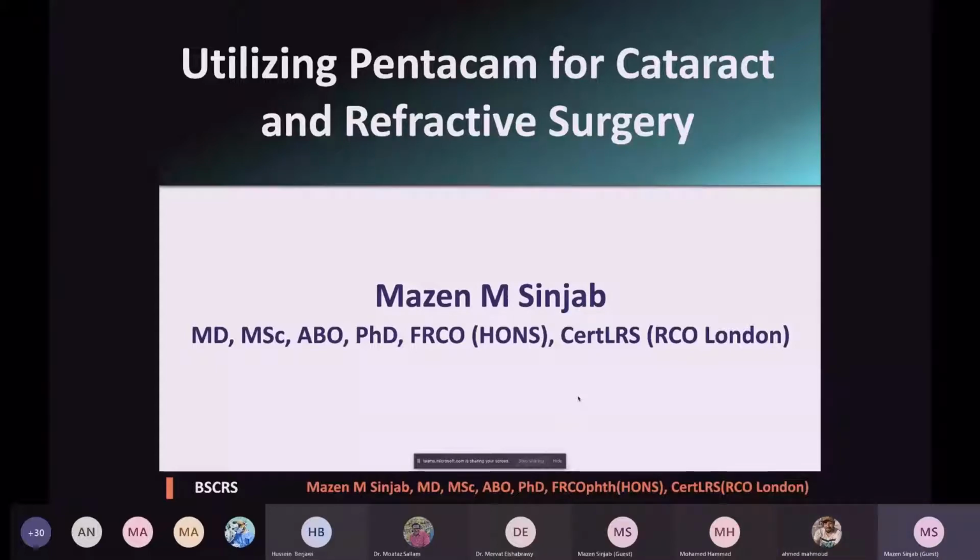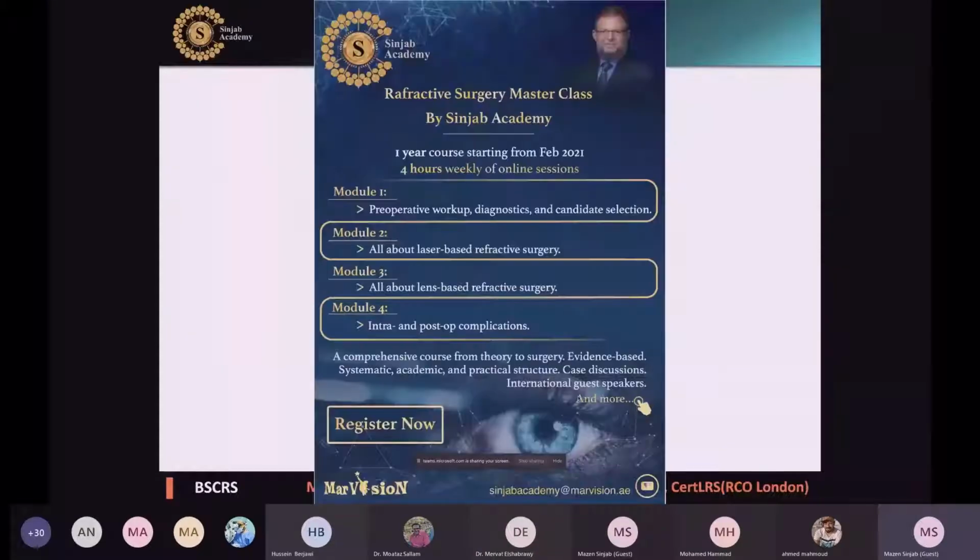So I'm going to talk within 45 minutes about utilizing the Pentacam for cataract and refractive surgery.